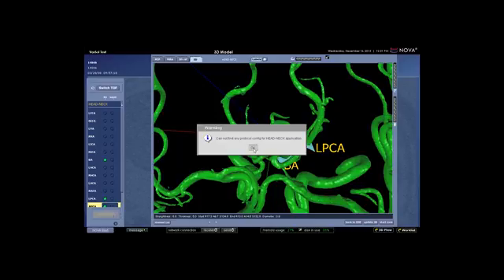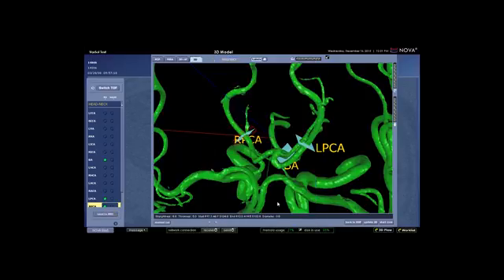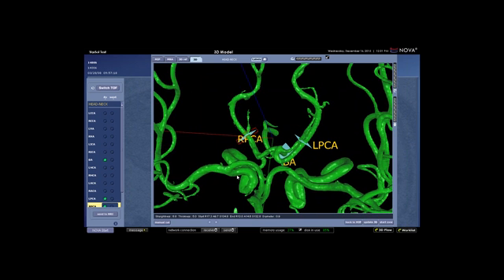to the scanner. Now I'll get an error here because I don't have a scanner in my office, and again we're just simulating how it would be in the real time setting. So those coordinates have been sent to the scanner. This technologist can pull them from the network. The protocol parameters are already set up on the scanner like any other protocol, so they can begin to scan those immediately.